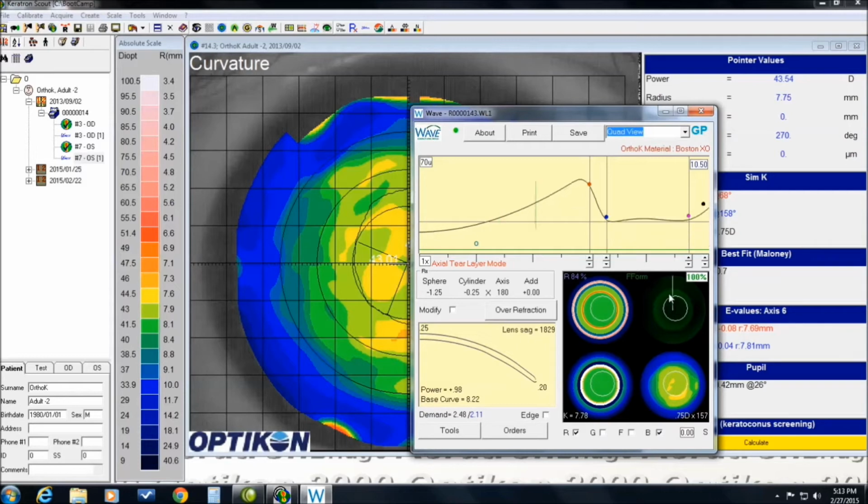Notice as I lift this periphery, it doesn't affect this too much, but it does affect the alignment of the other side. I'll go just one more step. So yeah, maybe another one, till we're in the 6s there. And then I look above and I see that that's 19 and this is 12.